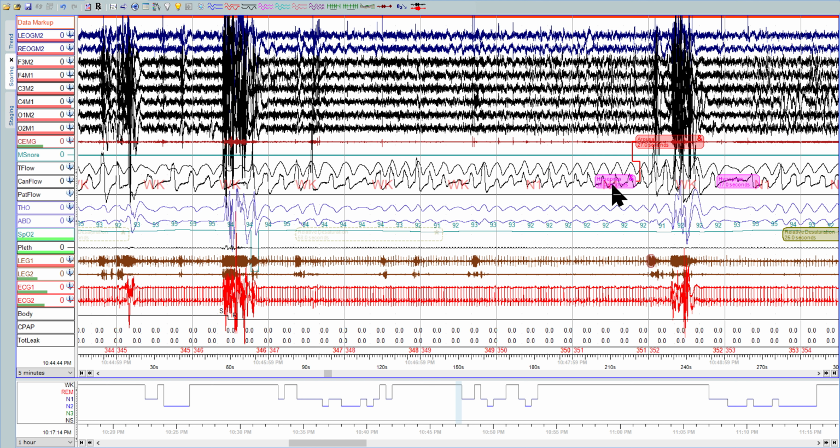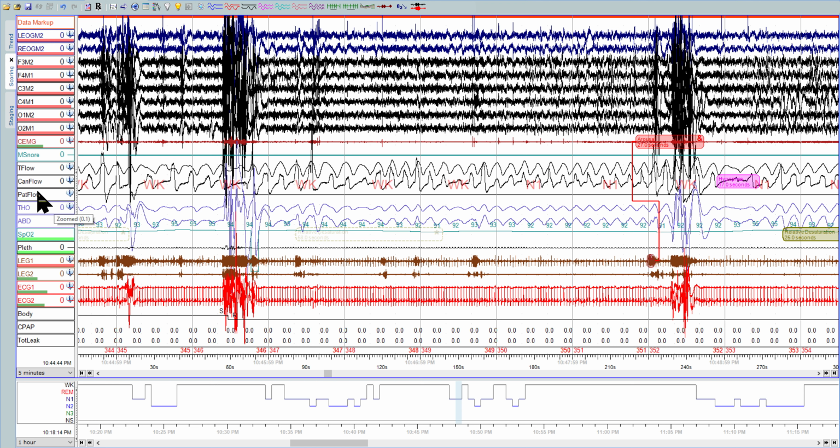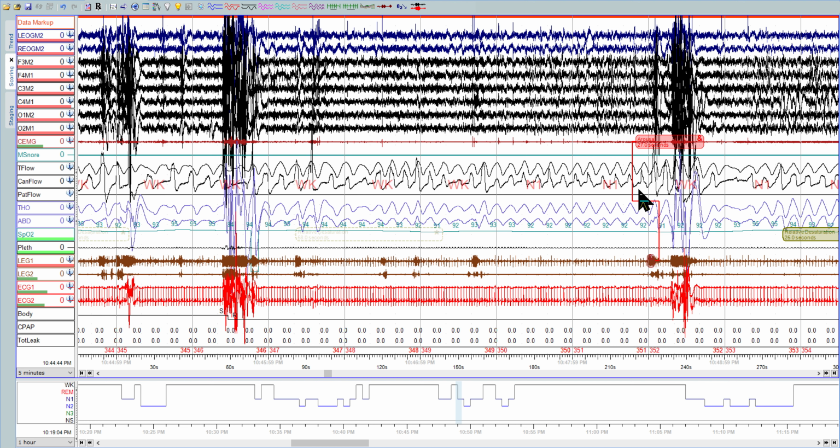This is touching your baseline here. So I don't think there's anything going on right there. Not sure what you saw. But there's no decrease in flow. See how it's all kind of touching the baseline. You've got an increase right here, but other than that, that's it. And then this is coming right after wake, so I'm going to delete this one as well.